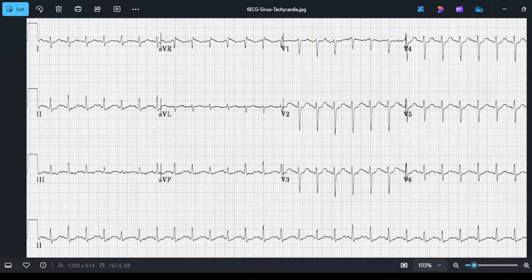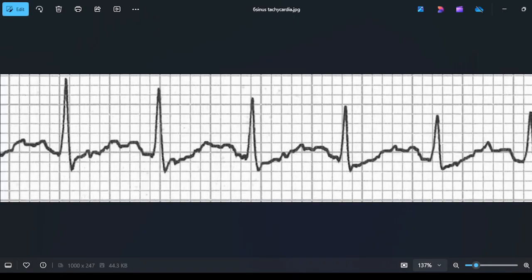We have one more picture of a sinus tachycardia. Let me go to the next slide. Yeah, this one is a very close up. This is again a sinus tachycardia. See again these 2 big boxes between 2 R waves, and again 2 big boxes between the R waves. So the interval between the 2 R waves is constant.